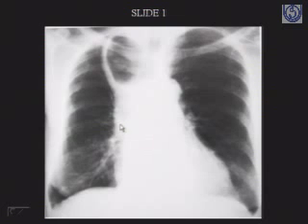What are you saying, please? Sir, if we see the right heart margin, the distance from the diaphragm till the opening of the superior vena cava in the right atrium is most of the time less than the distance of the lung field above that. Can you see the SVC shadow in this case? In this case, we are not seeing it. So how do you calculate that then?